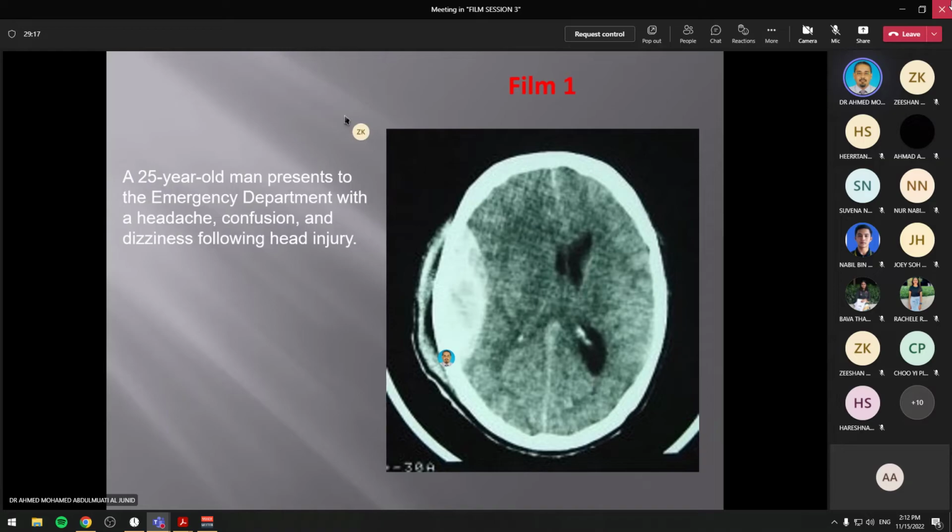Then after that, I want to give the diagnosis. How to give the diagnosis? All of you listen. When you give the diagnosis, under diagnosis number 1, you say the location: right or left, the region or specific location.